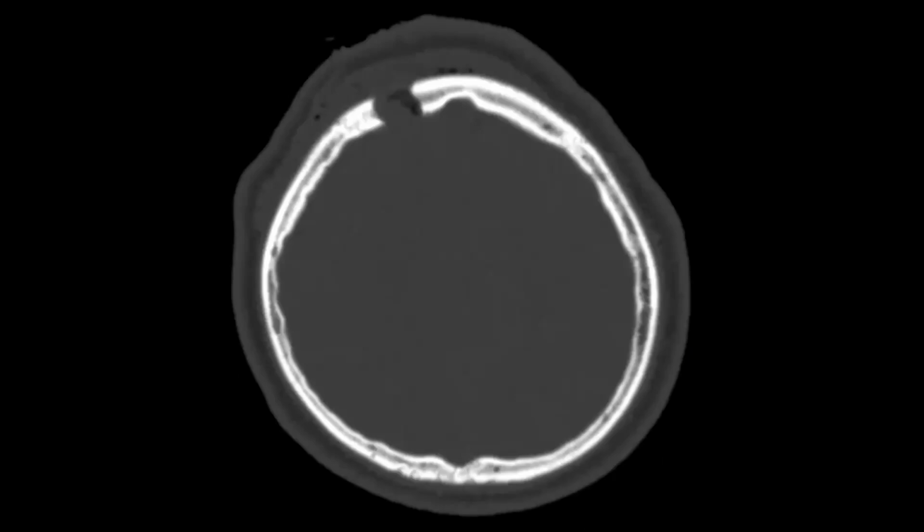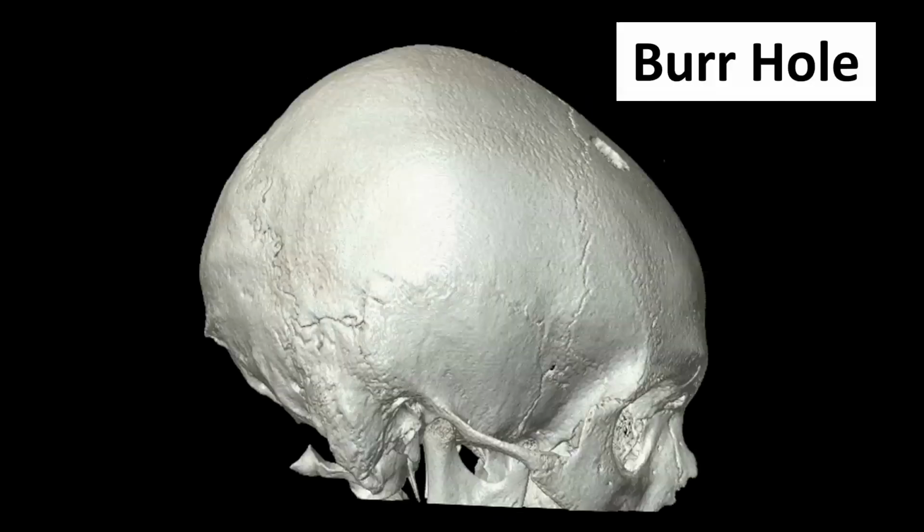You need to be able to visualize things in 3 dimensions. Now, of course, I made it more challenging because we have people of all levels of expertise in every field attending this conference: neurosurgery, neuroradiology, neuropathology. I had to make it a little more challenging by giving you basically a lateral view. All right, but it's still possible to tell it's a crater.